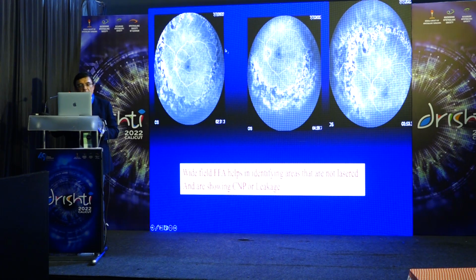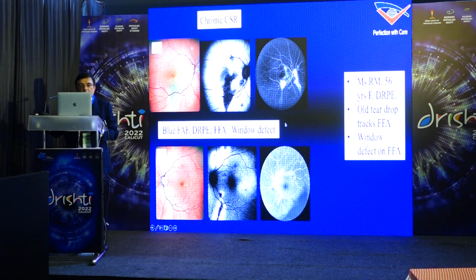Now, wide field angiography actually helps us to pick up areas of non-perfusion in the periphery which were missing out earlier, and these are the cases which we are able to laser in cases of a recurrent vitreous hemorrhage.